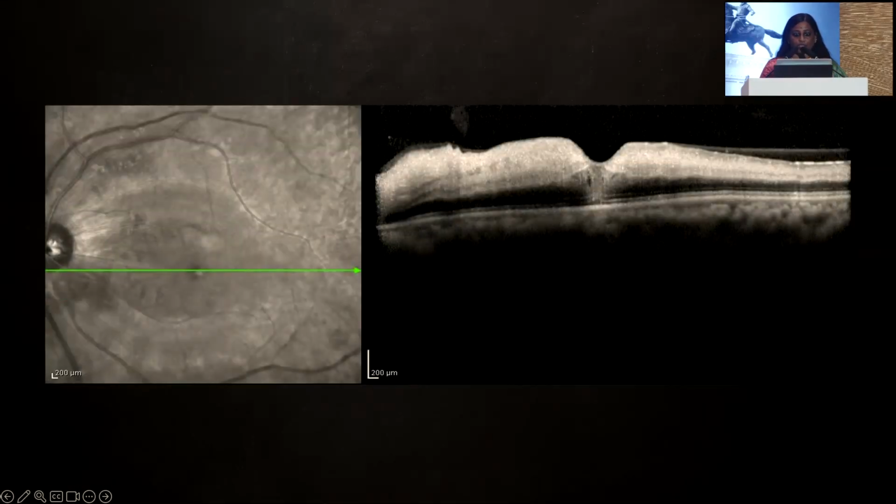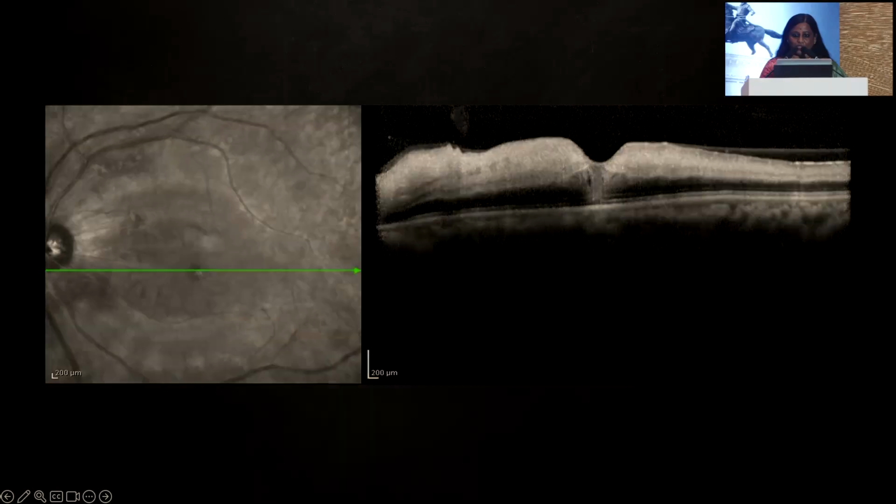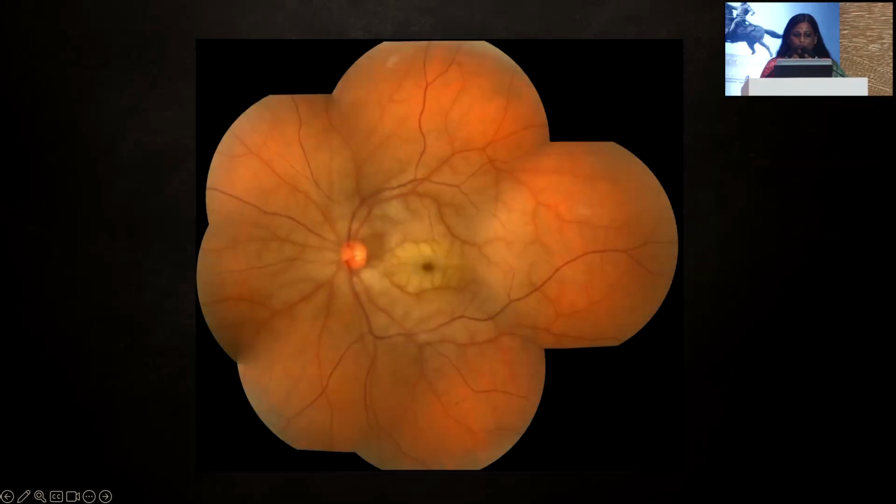Moving on, any guesses? One of the most common things again you may see. A subtle clue here. Arterial.